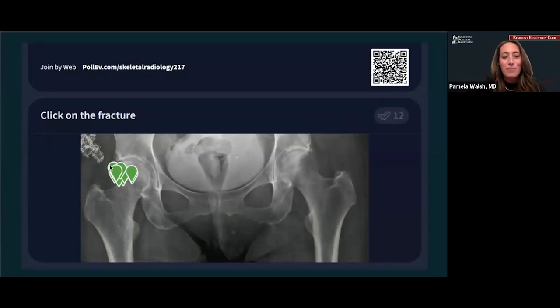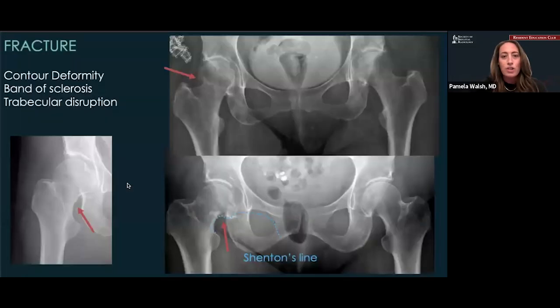So you guys noted that that fracture is at that subcapital region here. So this is that image there. And when we're looking for these fractures, they can be subtle. So what I recommend doing is tracing our cortices and looking for any areas where there's step off. So when we trace this here, we can see that there's all of a sudden this overhang of this cortex here. And we also appreciate that there's a bit of a sclerotic line. So this is a valgus impacted femoral neck fracture.